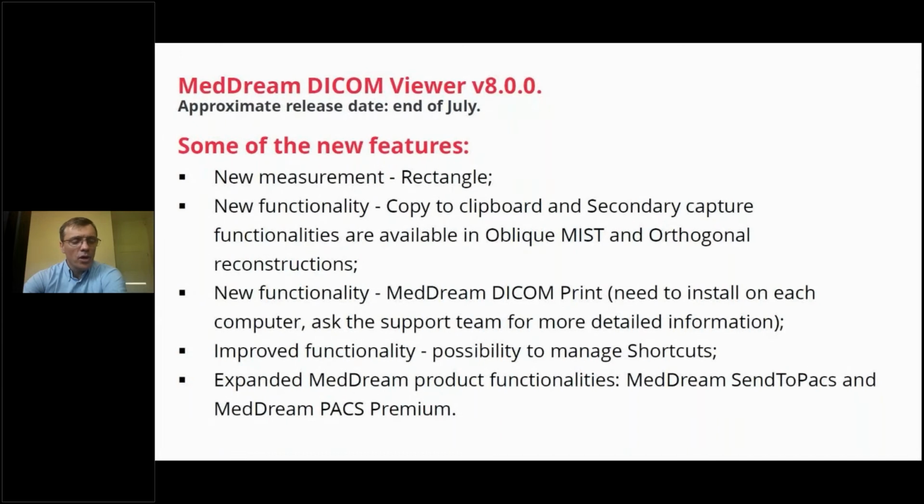This is the way we go. And we are even planning to go a step forward, extending the shortcuts. As you see now, we have quite a limited combination of shortcuts, but our goal is to try to cover all features in the long run by hotkeys. Each doctor could maximize the speed of diagnosis by using the keyboard and mouse and not move his eyes from the active image. This is our ultimate goal, which we're trying to achieve.